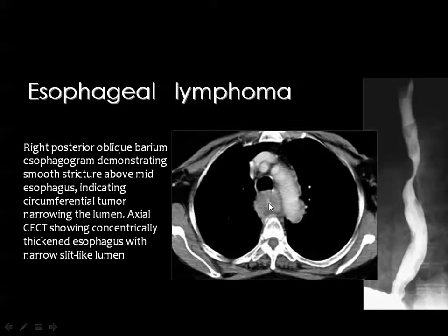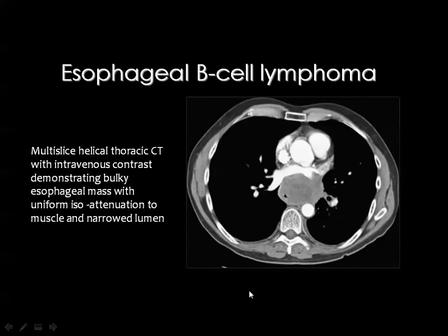The esophageal lumen is in the center of the mass. Then you know that this is malignant. But if you can see the lumen is eccentric, you feel that it is most likely a benign lesion. But this is also an example. You see the eccentric position of the esophagus, but this is not actually a benign lesion because of the invasion of the adjacent cardiac chamber.